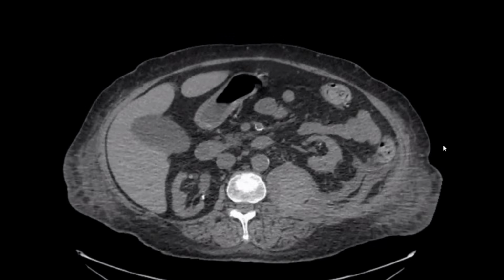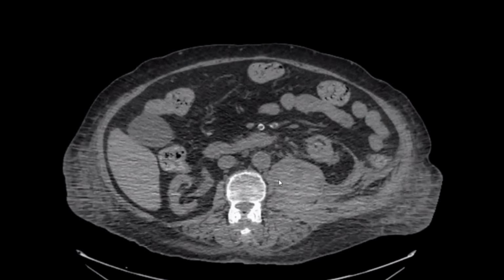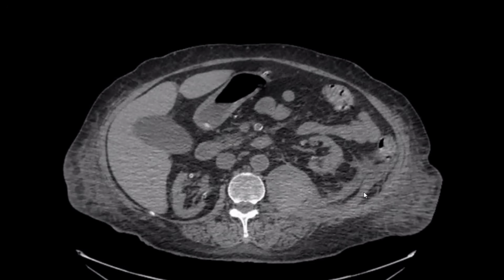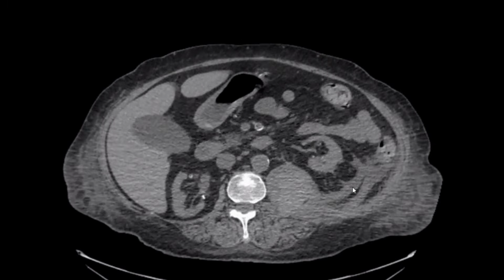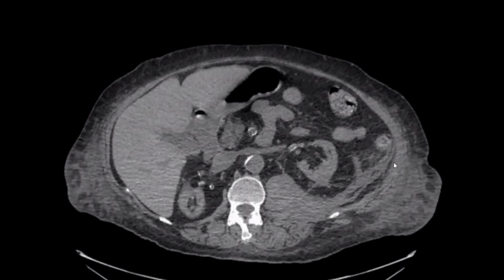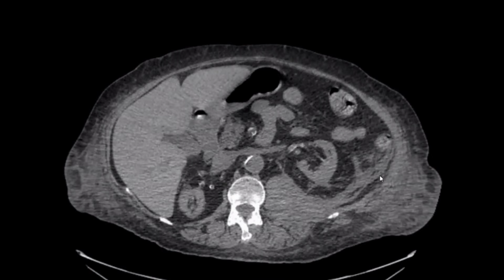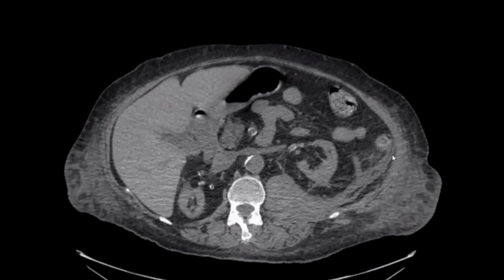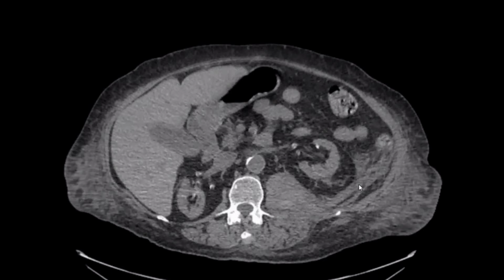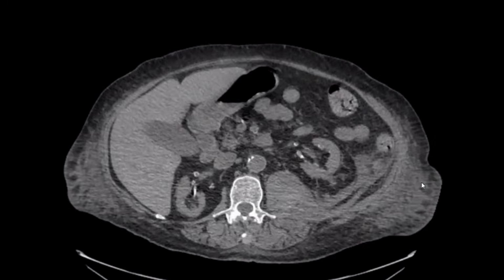In one of our cases that we discussed before, we have a large retroperitoneal hematoma extending to the posterior pararenal space, as you can see here. But at the same time, this posterior renal fascia is expanded by fluid content, so we can call it the retrorenal plane. We also have the lateral conal fascia, as you can see here. It is also expanded by the reactive fluid collection, so we have the lateral conal plane, not fascia, now that it's expanded. The retromesenteric plane is not expanded in this case.